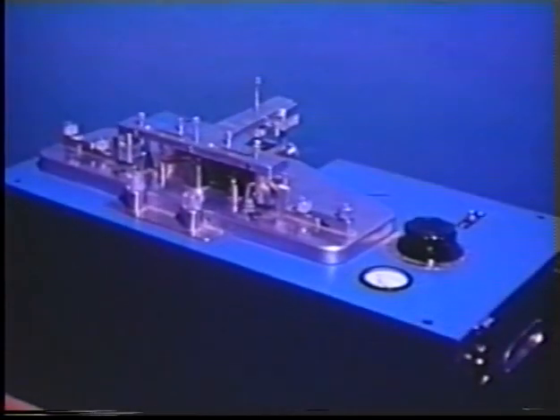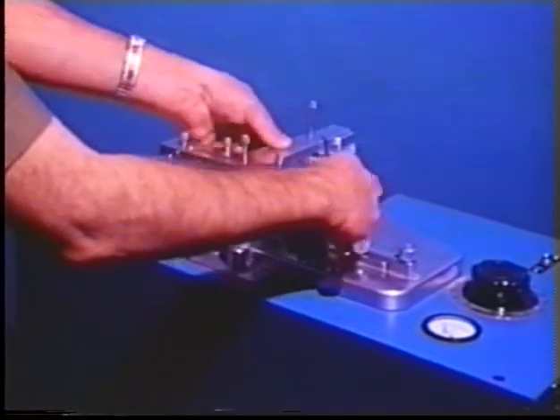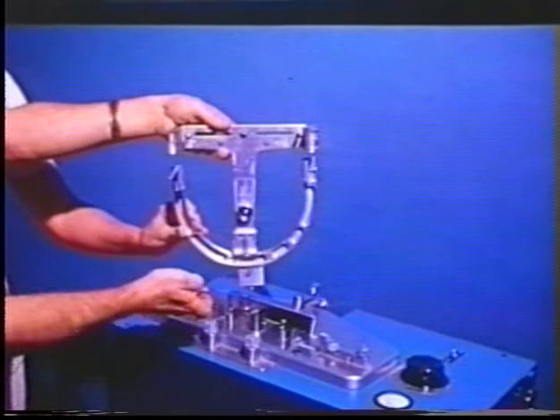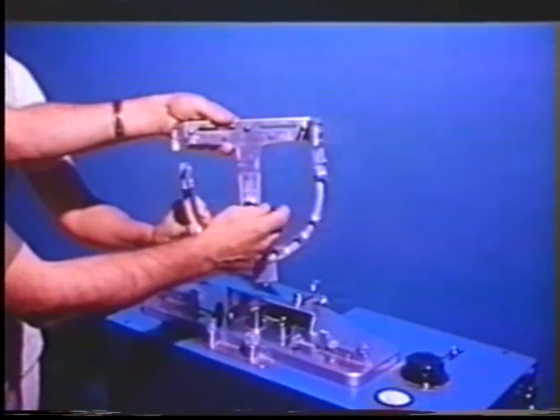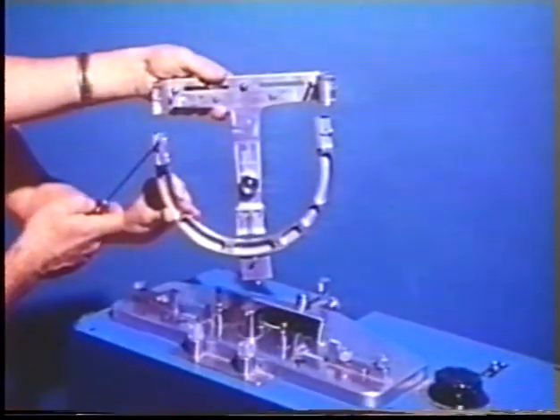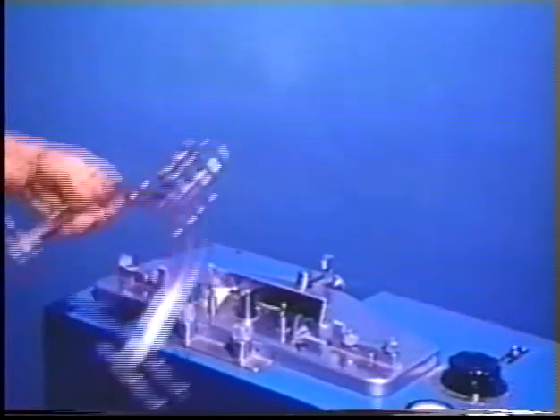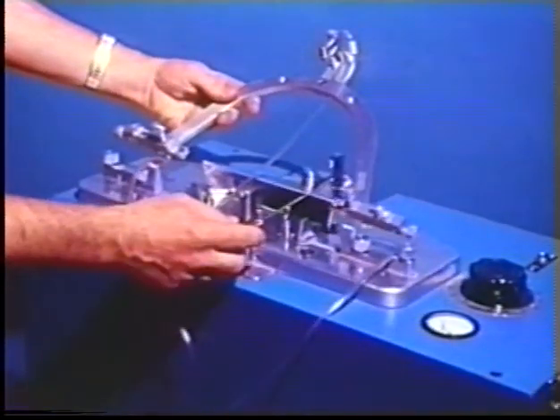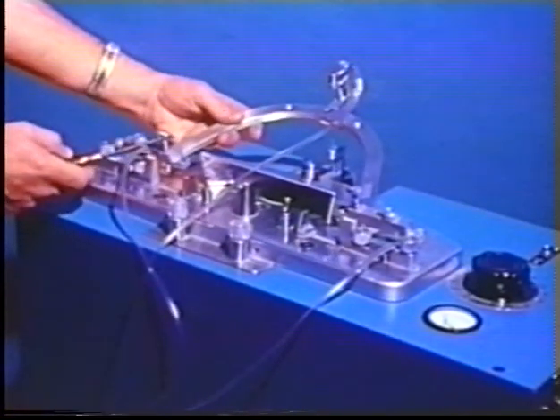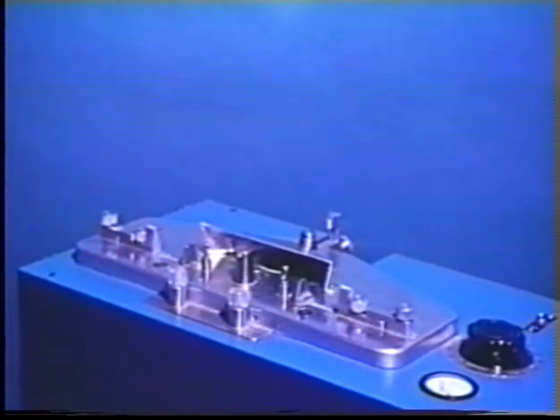Shown here is a full view of the reconverter, which is a second pantograph used to generate analog guides for an articulator. The T-shaped upper frame is removed and compared to the maxillary counterpart of the patient recording pantograph. The mandibular bow of the patient recorder is compared to the counterpart of the reconverter to show the smooth steel guide pins which substitute for the recording drills.